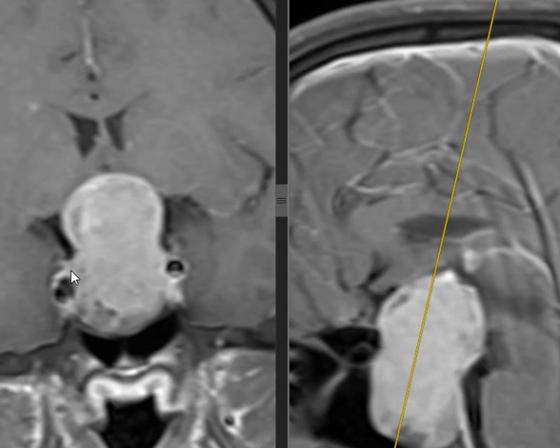Why? Pituitary macroadenomas are non-functional. He has no hormone elevated. If it was functional, it would be a microadenoma. We detect microadenoma due to increased hormone.